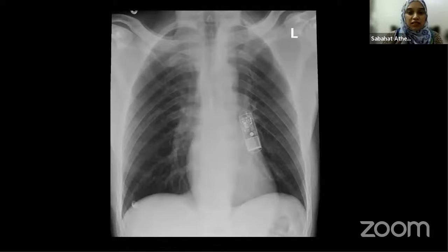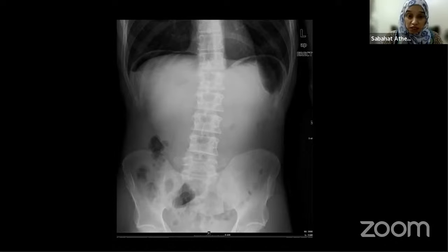So this is an abdominal X-ray, erect position. What are we seeing? Excellent, pneumoperitoneum. So if it's an adult patient and there's a pneumoperitoneum, what is the first differential which comes to mind? The surgeon is quite confident on his clinical examination and on the X-ray, and he's about to take the patient to the OR. Excellent, perforation.